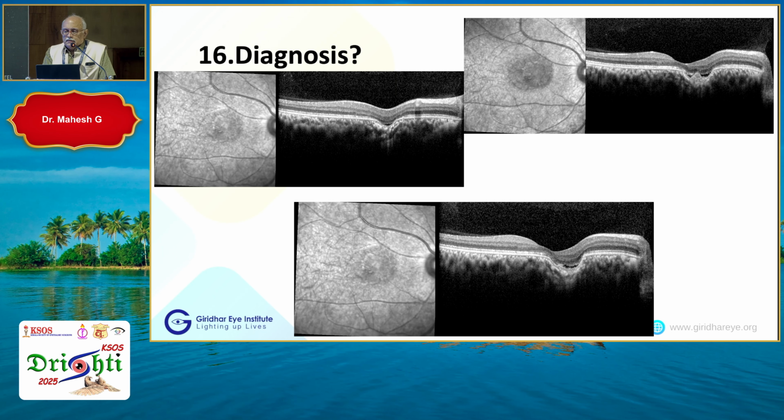This is another case. Anyone? Diagnosis? What is this? Anyone? We reported this in the Indian Journal 7-8 years back. It is called focal choroidal excavation, which is seen in some of the pachychoroid diseases.